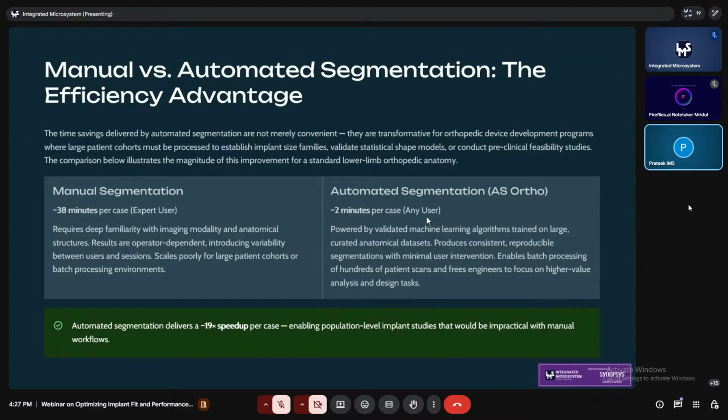When you work on the segmentation, it will create a mask out of it. When you go to the mask similarity calculator, you select the mask that I've created by automated segmentation. You will find it to be 100% or more than 99% efficient segmentation.